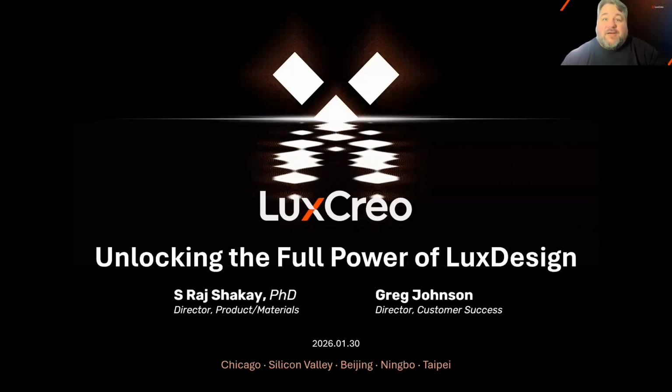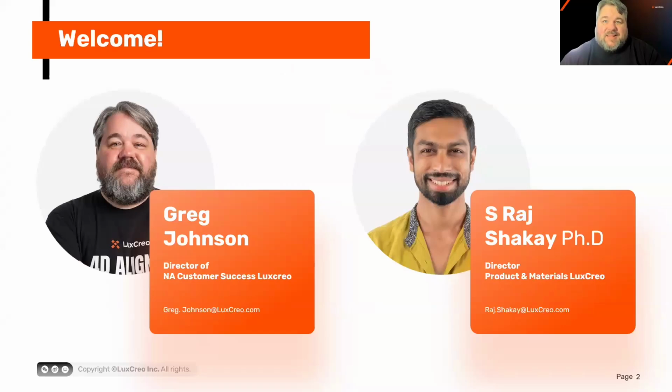Together, we regularly hear from LuxDesign users that they are comfortable with creating basic aligners and retainers, but they would like to be able to do more complex appliances, but they don't know how to customize things in LuxDesign. This is why we created this webinar. We're going to do a deep dive on some powerful features that you may not have realized were part of LuxDesign and how it can help you create appliances you need for your patients.